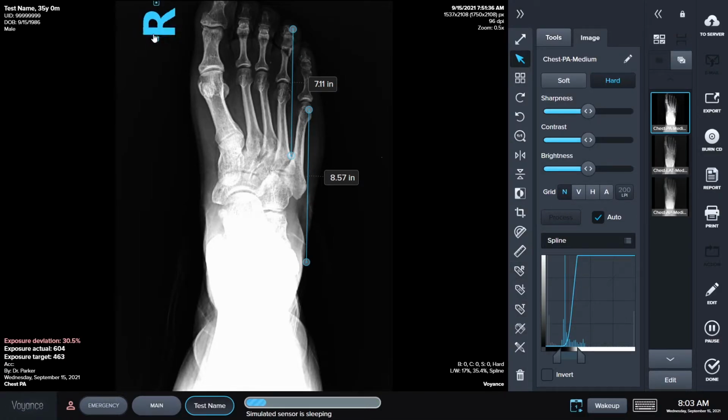And when you apply this, you can move them around with that. You can adjust the size with the right box here by going left and right. And if you want to delete, press the delete key once it's highlighted. Same with the other tools here. So I'm going to go ahead and do that.